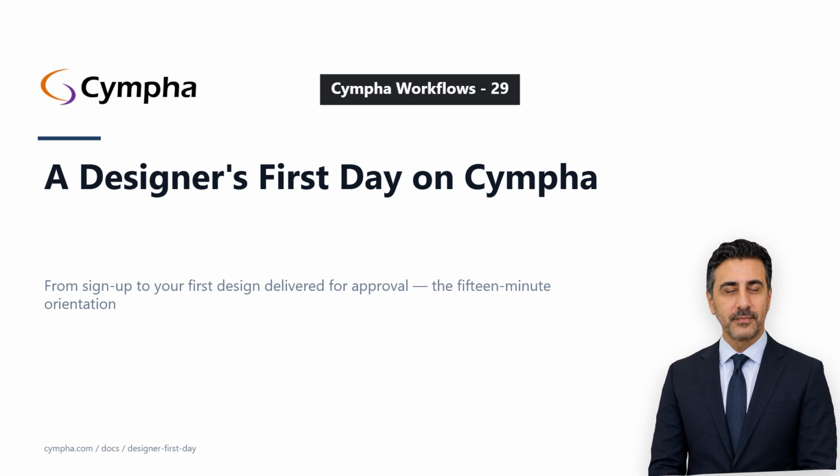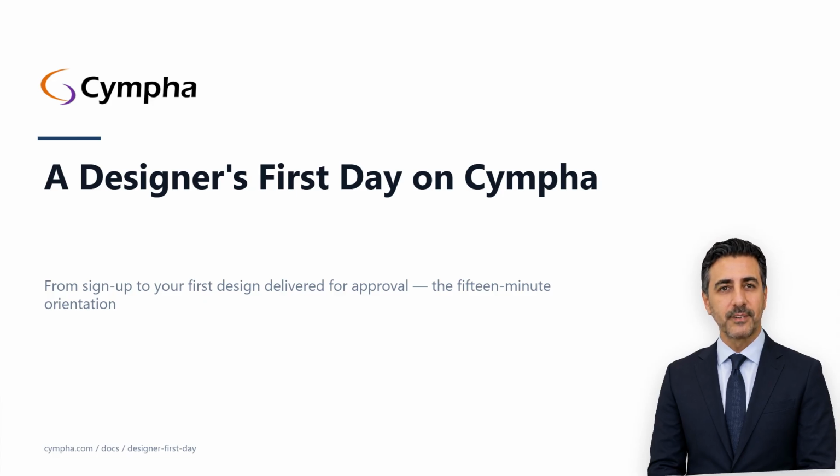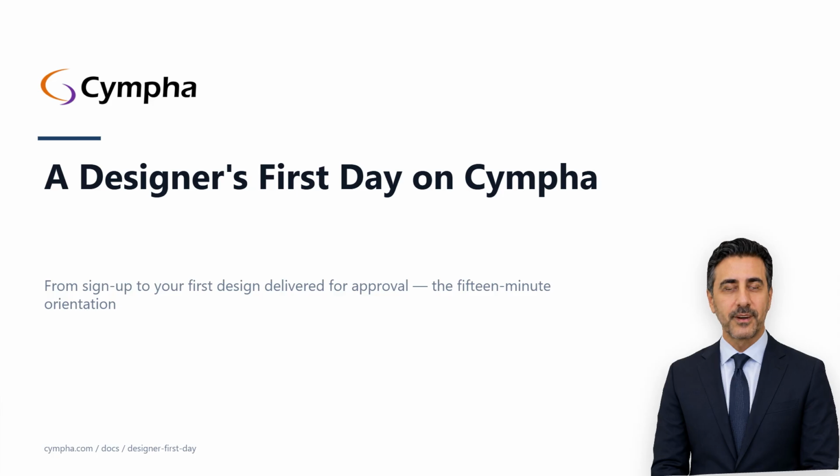You've joined a lab, someone told you your cases will appear in your Cympha, and this is the orientation that turns that sentence into a working setup. By the end, you'll know how your account gets approved, where your assigned cases show up, how the Cympha Agent Manager moves files between the cloud and your workstation, and how to deliver a finished design back to the customer for sign-off. The first pass takes around 15 minutes, including the agent install.